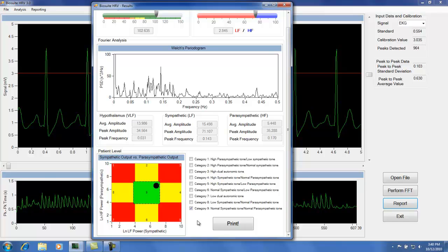It's compatible with lots of different Adobe readers, and you can import PDF documents into an electronic health record if you have one of those in your office. Most electronic health records support PDF format, and so we went with that file method as an easy way of saving our documentation.